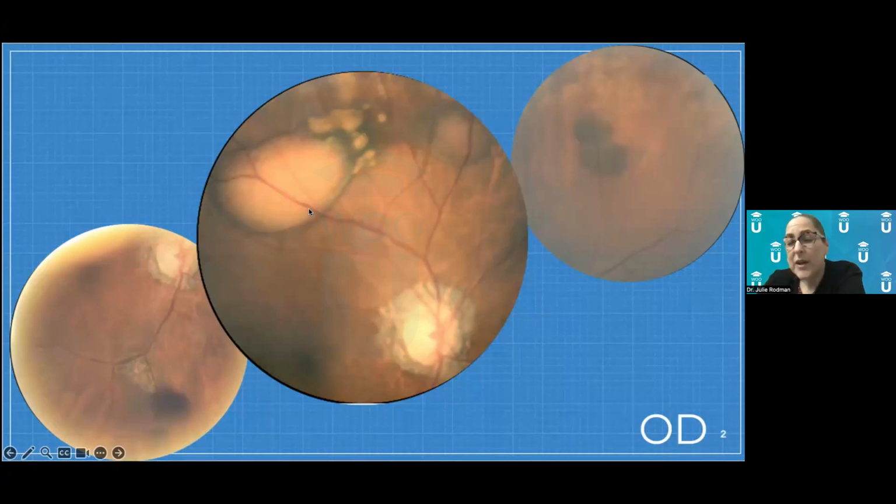So number one, I knew that they looked deep because these blood vessels are coursing over them. But God, I didn't know when I first looked at it what the heck I was dealing with. You can see on this picture on the bottom left, there almost looked like there was a resolved dark hemorrhage. And what I like to tell the students in class is that the darker the hemorrhage, the deeper it is in, let's say, retina choroid.